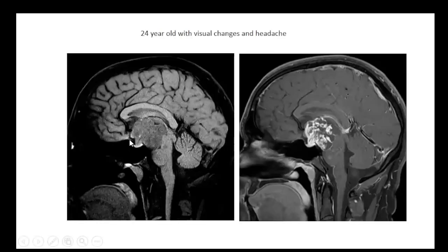Excellent. That was a classic case of a craniopharyngioma. So to begin with, you see that it's separate from the pituitary gland, so we eliminate the notion this is of pituitary origin. You can see the elevation of the anterior commissure, and the displacement of the tissues here in the interpeduncular cistern. The enhancement is important, and it takes you away from the diagnosis of a Rathke's cleft cyst, since they should have no enhancement. So now you're left with this question of, could this be a glial tumor, let's say like an optic nerve tumor in this location?